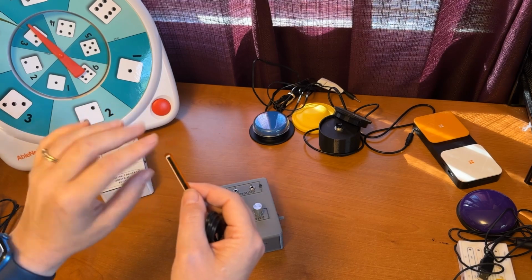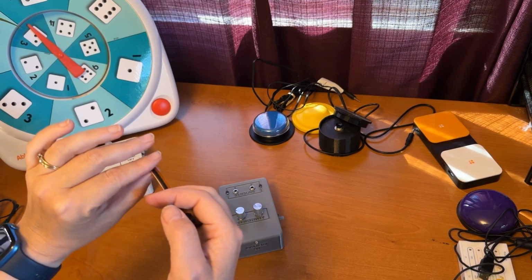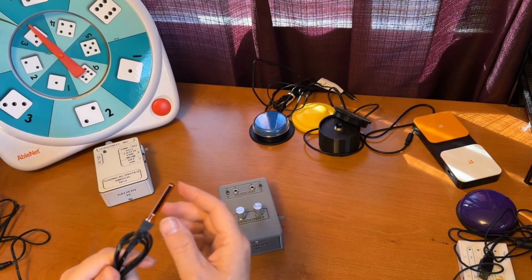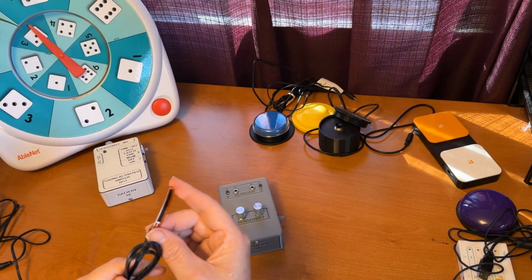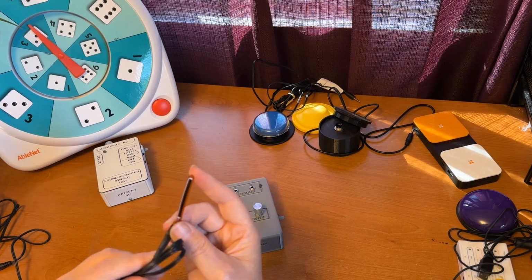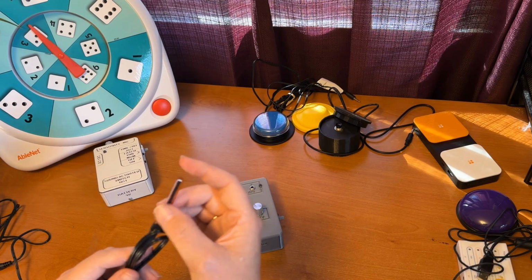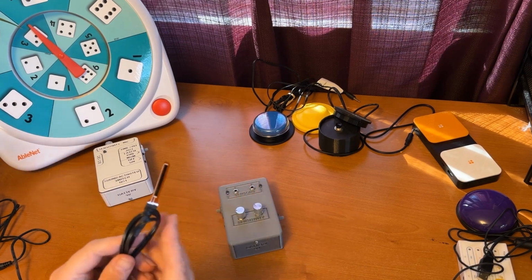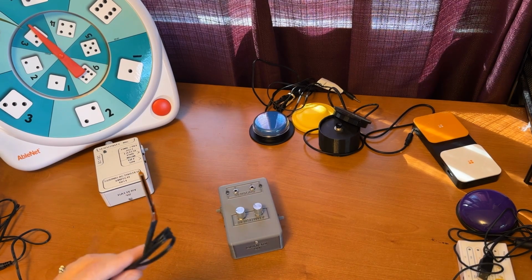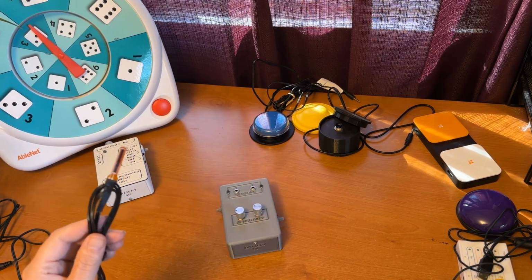Use a piece of medical grade tape and tape one piece here and one piece here on the user, and when they bend it, it triggers. This could be used on the face, where somebody raises their eyebrows and it bends it. Or it could be used if somebody bends their finger. Any movement that the user has that can bend this little piece of flexible metal in here will trigger the switch with this box. So again, just like pushing those buttons, but this time it's going to be with a sensor.